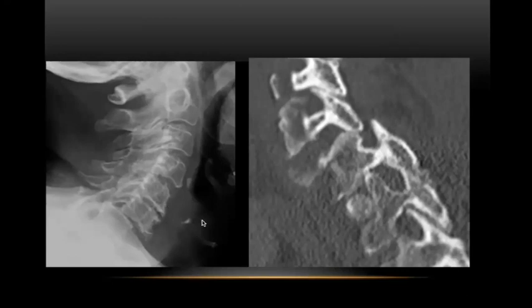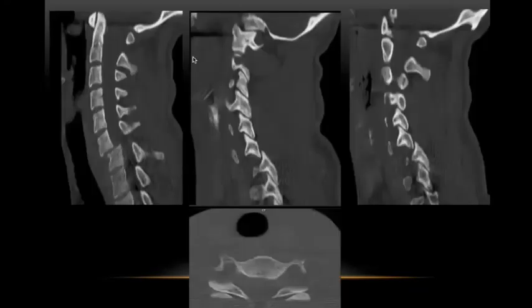So again, you can see here, try and trace it. Tiba-tiba dia lari ke belakang sini. Ni kan, sini tiba-tiba step ke belakang, right? So you have one here. So that's the bow tie for you. So on CT, it looks like that because dia dah lock, you cannot do anything about it. Patient pun tak boleh gerak dah. Okay. Right, so this is the CT reconstruction.